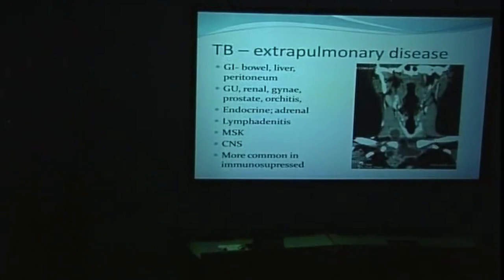Lymphadenitis is quite common, and we commonly see an appearance like this. Now, I haven't included any slides of ultrasound, but ultrasound is very useful in investigating particularly superficial lymph nodes like this, and you can guide a needle into that for diagnosis. You can aspirate and get material for culture and sensitivity from ultrasound-guided aspiration.